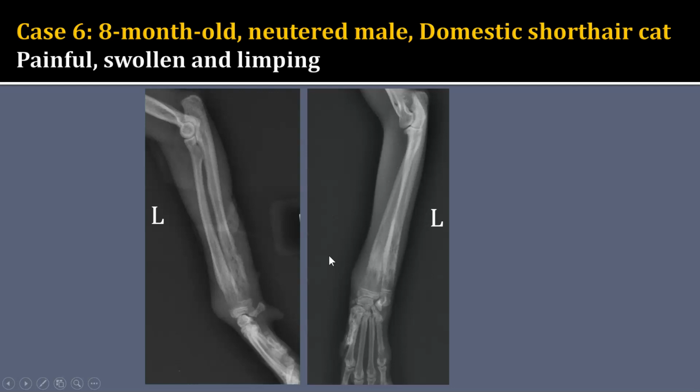So this is all extracapsular soft tissue swelling. Looking at the osseous structures, we start to see quite a bit of abnormality when we get into the distal diaphysis of the radius and the ulna, and then moving down into the metaphyses toward the physes. This patient has very severe lysis. Some of it is moth-eaten, some of it is permeative, some of it is just completely gone, so you can't even give it a pattern. So severe lysis involving the radius and the ulna.